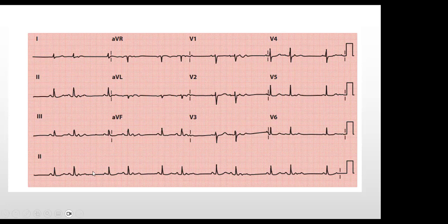This is the prolongation you're talking of, right? Yes. No QRS complex follows it. Then a PQRS starts with a PR interval that is shorter than the last one observed, as in the second complex. So that qualifies for a Mobitz 1 AV block.